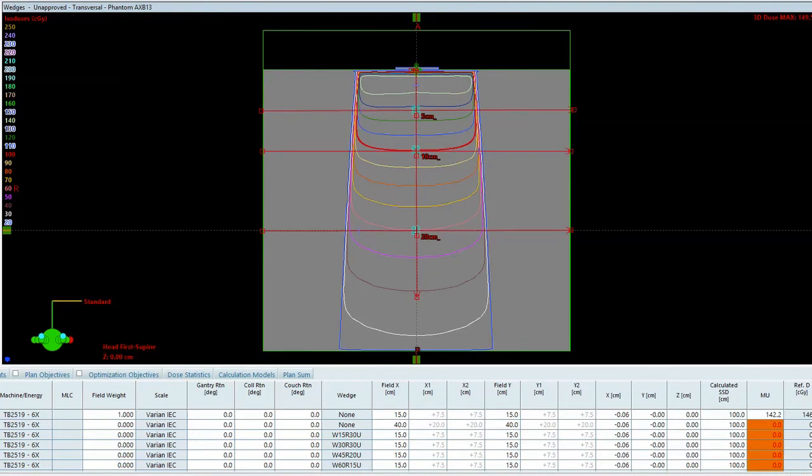It changes a little bit because the 18x profile has a different flattening filter and then different photon characteristics associated with that flattening filter. But the general shape of the open field profile is similar between open field beams of different energies.